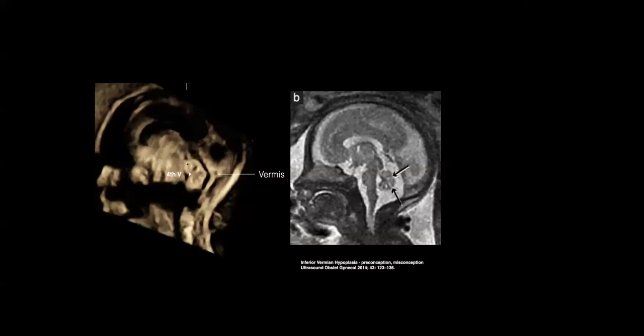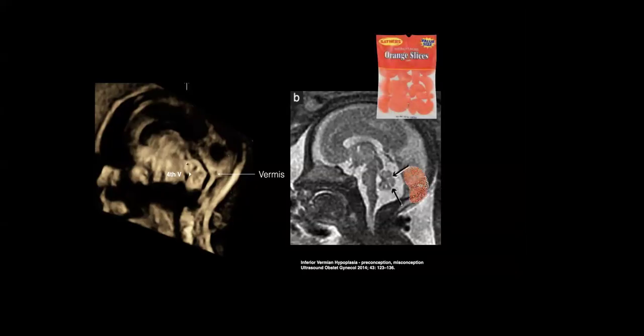It kind of reminds me of a kidney. I don't know. I feel like sonographers, we always compare everything to an object, food or fruit, whichever, but enough to keep that, I guess you could say, pattern recognition. Here's just an MRI, which is really helpful to see how it also reminds me of a tangerine. I don't know if you guys ever ate this back in the day.